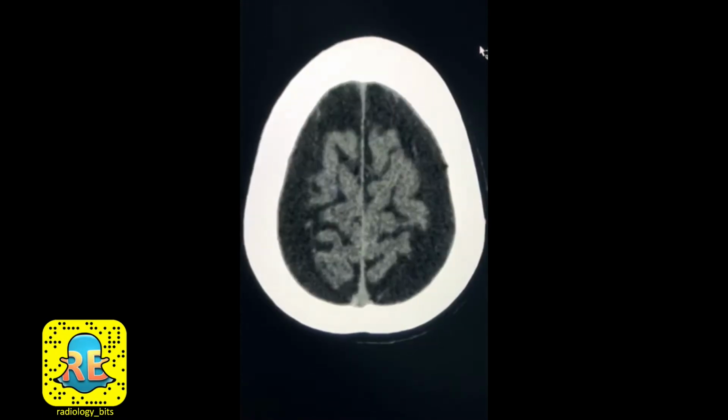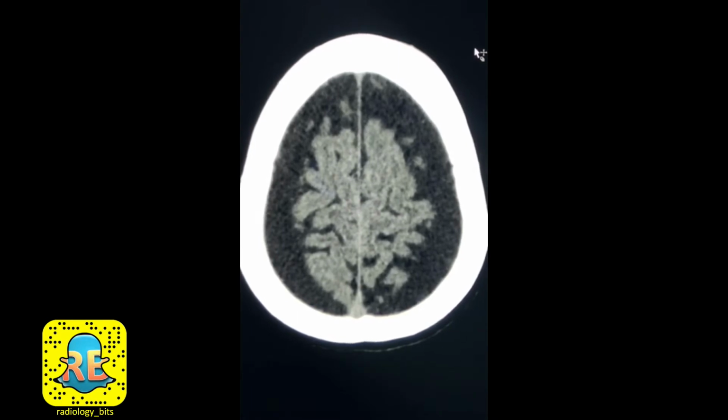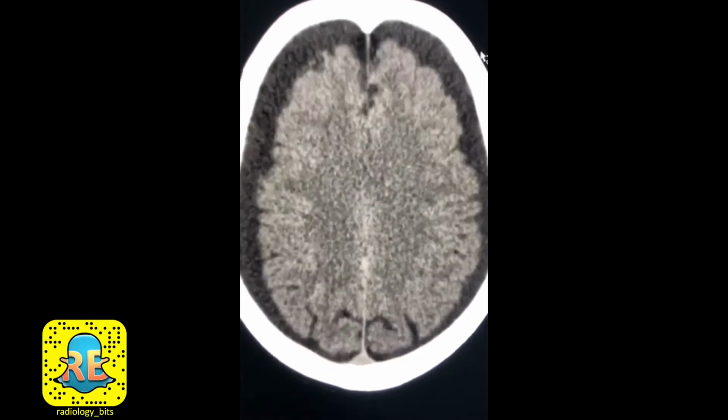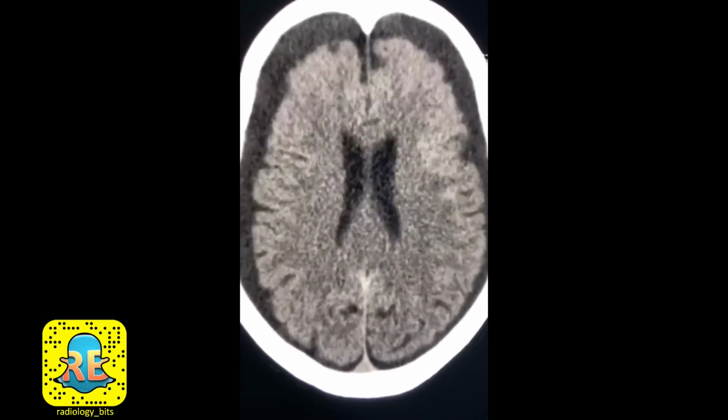Hello again. This is a quick neuroradiology case. The case is intended for students, interns, and specifically junior radiology residents because a few of you guys asked for similar cases. This is an 81-year-old male patient who presents with recurrent falls and syncopal attacks.